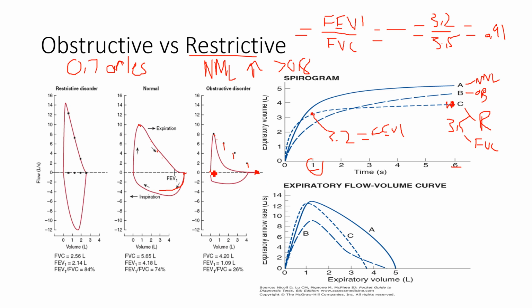Again, remembering FVC is really this point to this point. Okay? So for them, again, we see big reductions in peak expiratory flow. FVC is preserved roughly, and the biggest hit is what we see occurring during the first second. Again, this is another example here, B. Restrictive disorders, we can just look again, the volumes are just smaller. FVC is reduced, and again, if we look at our plot on volume time, both are reduced similarly.